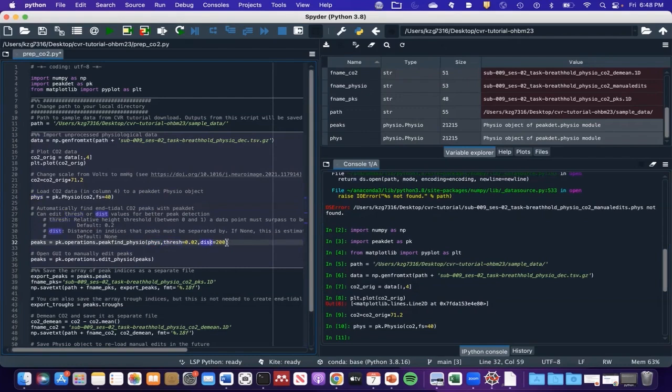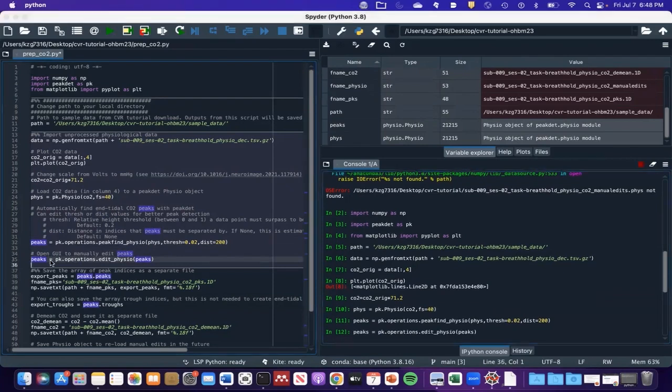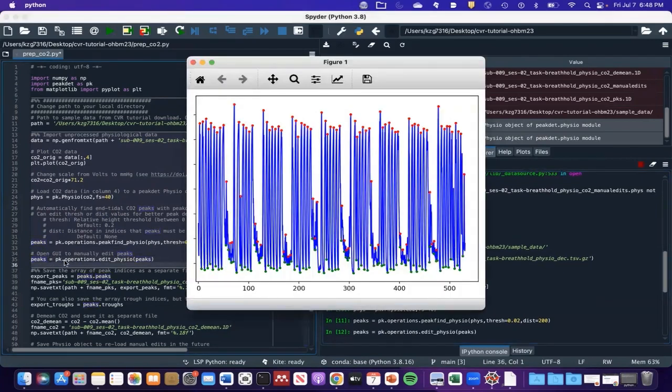So this is our CO2 trace during a breath. And this is the exhale portion, and that end tidal value is the peak at the end of that exhale. So we're looking for a very clear plateau shape, and that is what we decide as a good end tidal value.